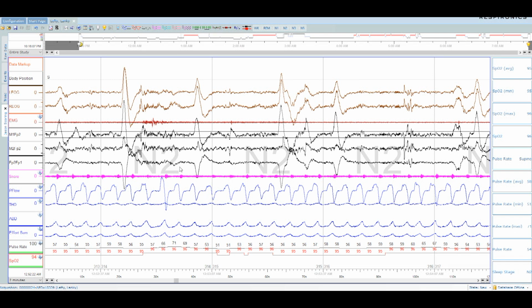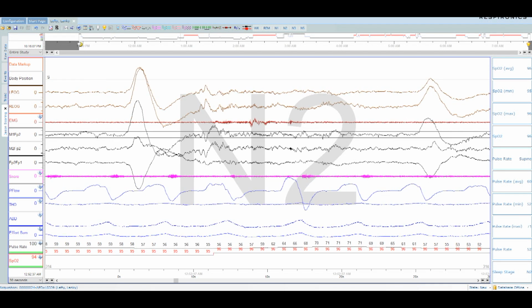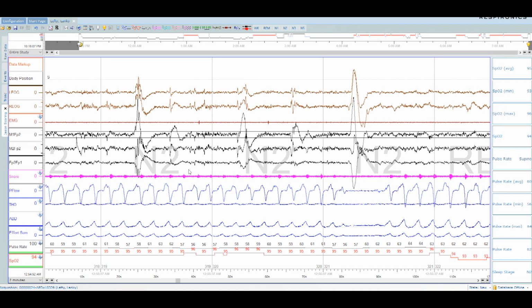Looks like we have an arousal right there. Let's take a look. Maybe, probably. I'm not going to call out 1 because that's pretty weak and it's definitely not long enough. That's what she said. Meh.